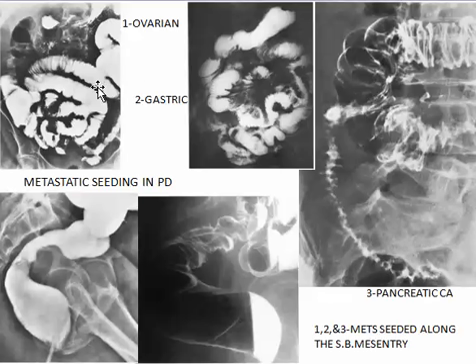An ovarian tumor can produce irregular subserosal deposits causing irregular lumen of the small intestinal loops at the pelvis. A gastric tumor can do the same, multiple subserosal tumors indenting the small intestinal loops from outside. It is subserosal.